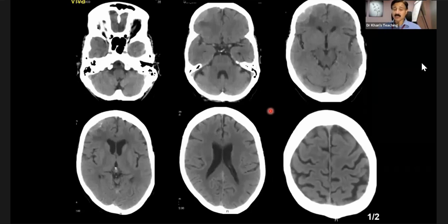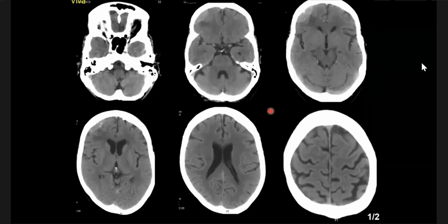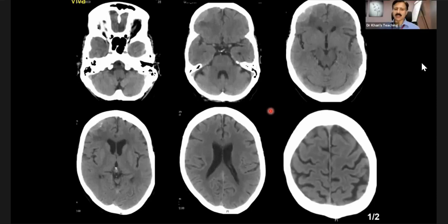Yes, please. A&E, history of trauma. So there is an acute, or rather subacute kind of extradural hematoma on the right inferior frontal lobe. Extradural hematomas are not subacute. Extradural hematomas will always be acute. Yeah, I mean, the density looked slightly less than to my liking, so that's what I was thinking. That's a very good thinking.